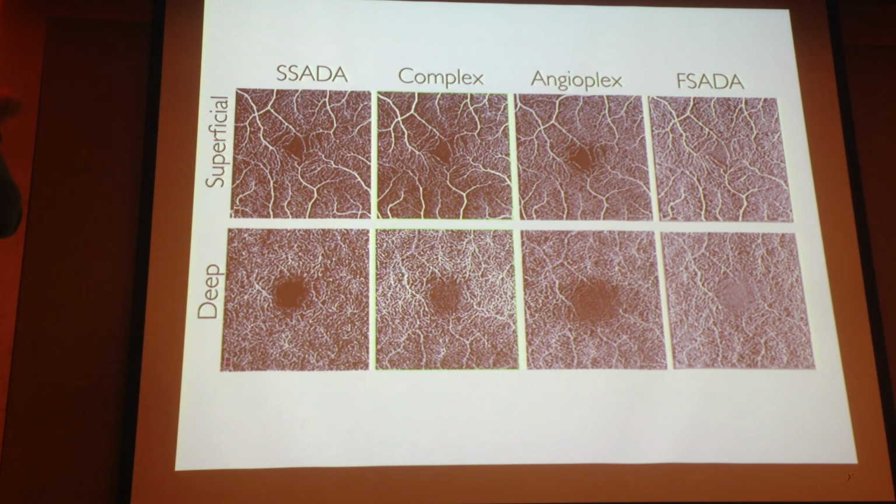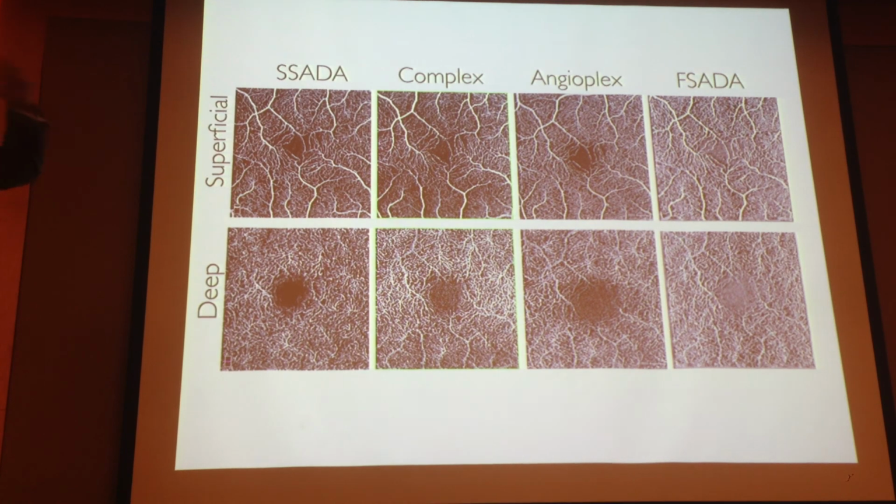So I thought it's because the scan lines go from the top to the bottom, and maybe the patient's eyes are getting dry. It could be. I confess that I don't know if it's related to that. It could be just because the quality of the B-scan here is not as good as the initial part. So you can actually have some movements, or it takes more time because these are complex cases.